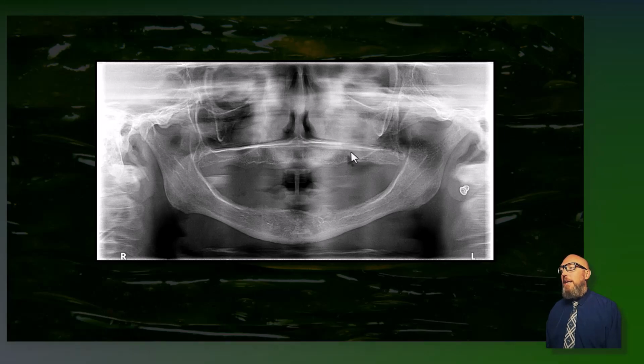The opacified sinus alone could just be sinusitis. Again, look for those chronic signs of inflammation, for sclerosis of the sinus border. But in this case, we see some destruction here, and so that's concerning. This patient needed a referral for ENT, both for that concern and also the risk of mucocele when you have a completely opacified sinus. And so remember, an opacified sinus is one thing. An opacified sinus with a missing border is something else entirely.